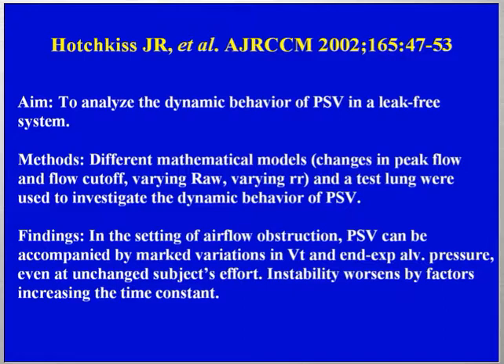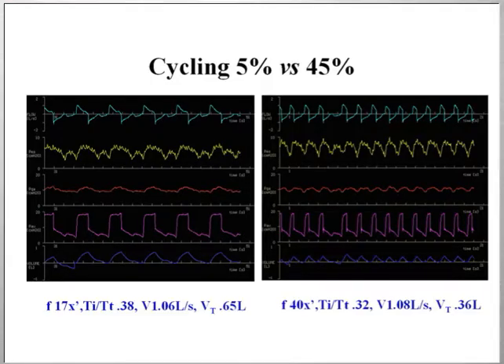And I think that this is clinically relevant because this fits very well to patients with chronic obstructive pulmonary disease who are ventilated with pressure support. This may happen, for instance, here with an individual who had a very severe COPD with relatively normal respiratory system compliance and a very high airway resistance. And you can see how this patient is ventilated with exactly the same levels of pressure support, about 12 centimeters water above PEEP, above external PEEP of about 5 centimeters water.